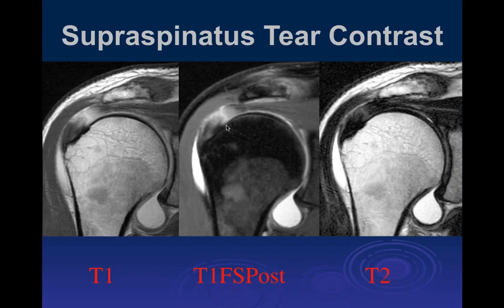Where did they inject it? Do you happen to know where they injected the dye in this case? Generally, the dye is injected, most of the time here, in an anterior approach into the glenohumeral joint space. You can occasionally get a little bit of leakage into the subacromial subdeltoid bursa, but I've never seen, just from the injection, enough to pool like this. I get it. Okay, I would be very reluctant to operate on this case.